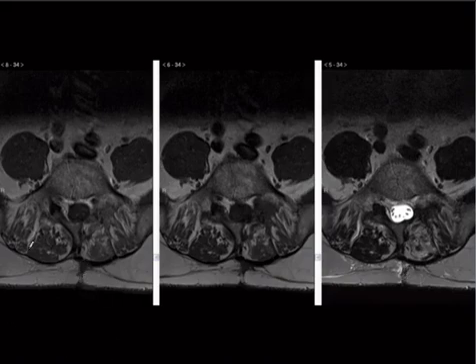If you don't see an obvious bone, I mean, he has a bone defect here, right? But sometimes it's not so obvious, you're on the fence, did the guy have surgery or not? Look at the skin. It's pretty hard to get in there and muck around without cutting a hole in the skin, and usually it looks like that. So that's a somewhat practical trick too. Okay, so the point of this case is to show you, if you've ever been involved in protocoling for spine MR, you may have noticed that sometimes people get contrast, and you think, oh, contrast, that's like infection, right? The other people who get contrast are anybody who's had surgery, especially in the lumbar spine.